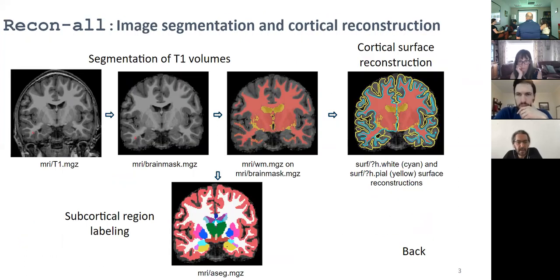And that's mostly the cortical ribbon, or is there something else you can use for parcellation? Can you do automatic parcellation of subcortical structures as well, for example? Yeah. In terms of the theoretical definition, yes, you could parcellate, say, the caudate into a head and a tail. You could parcellate the thalamus into its subcomponent nuclei.